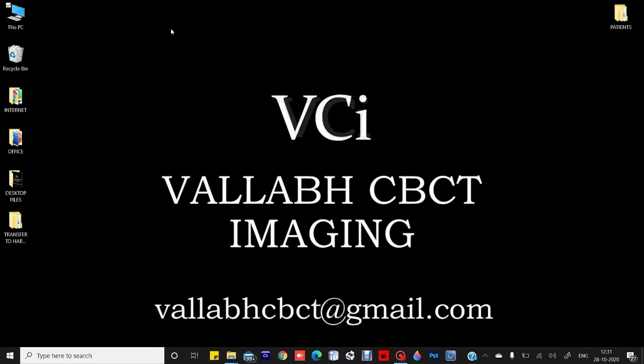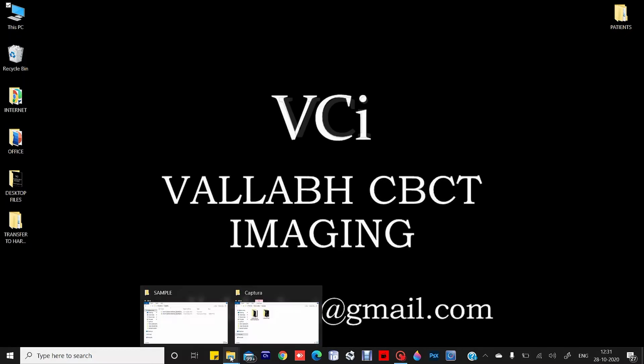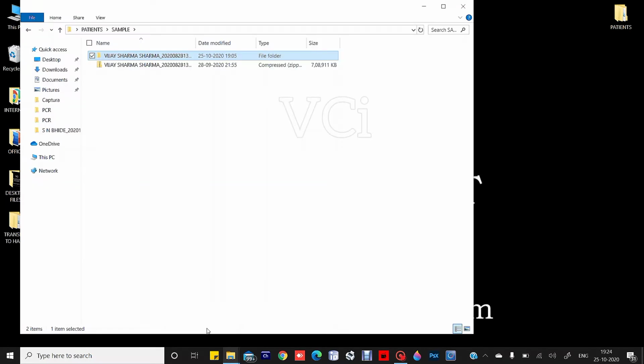Hello everyone, my name is Dr. Vallabh Chawla, specialized in oral medicine and radiology, and today I'll be sharing some valuable information on how to use the CBCT software. So firstly, when I send you a software, it will usually be in compressed or zip format.